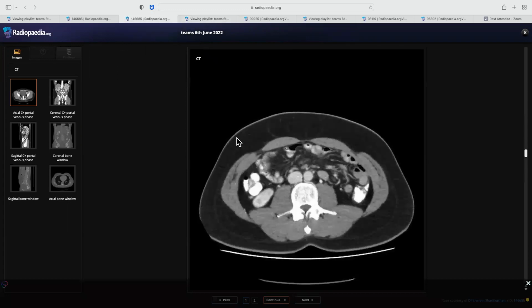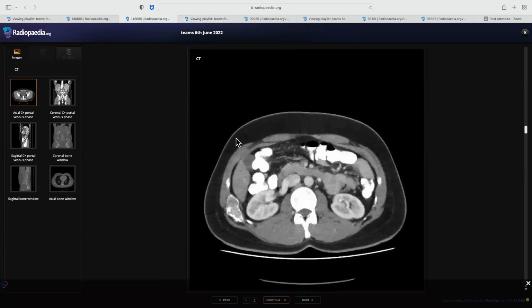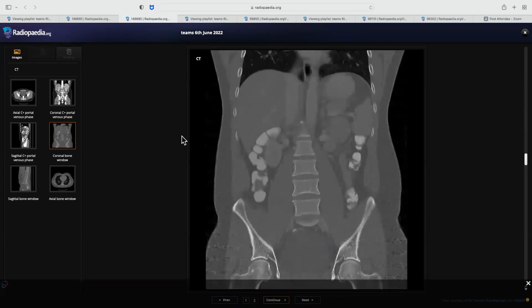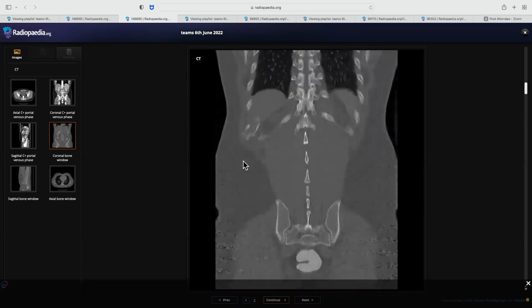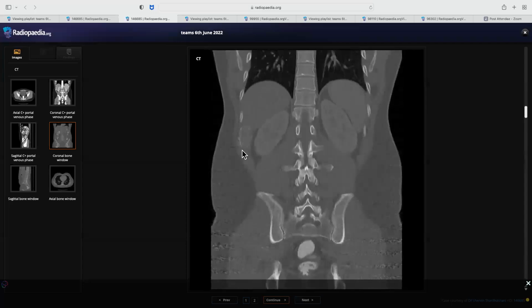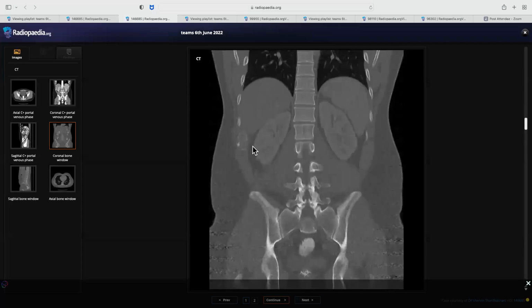Okay. This was right. Once I told you that's not, see, you were right, there are areas of cortical breach, but if you follow this, it is still following the contour of the rib. Nowhere is it totally coming out of the rib with an associated soft tissue mass or something.